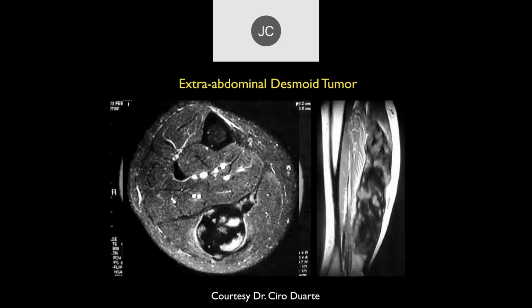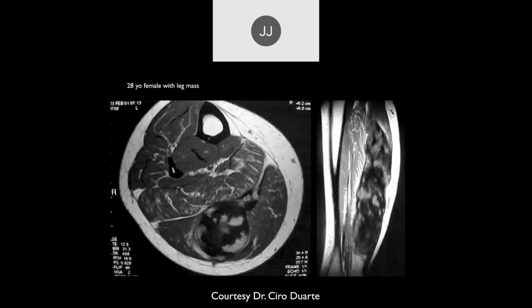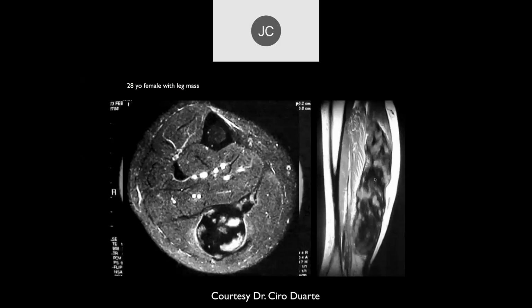But see how large this is. I could show you a very similar lesion, which would be a malignant lesion. Because again, if you remember, size is also a major component to increase the risk for malignancy. So I would really think that you would have to put this in the category of a potentially malignant lesion in the workup on this particular case. And it has to have a wide excision also. These recur.